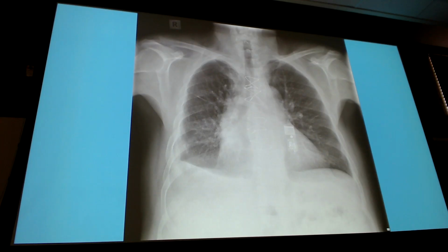There too. There as well. Pardon, I wish the drawing thing would work well. It'd be a lot easier than me flashing the light at it. Good. What else do I have? Something we've talked about on this particular image.